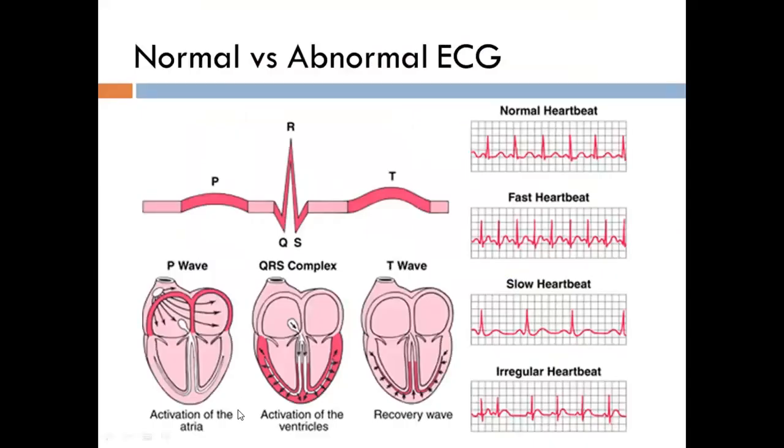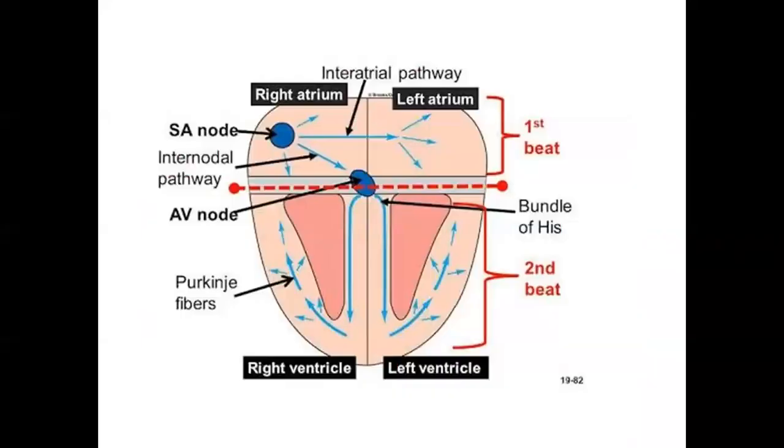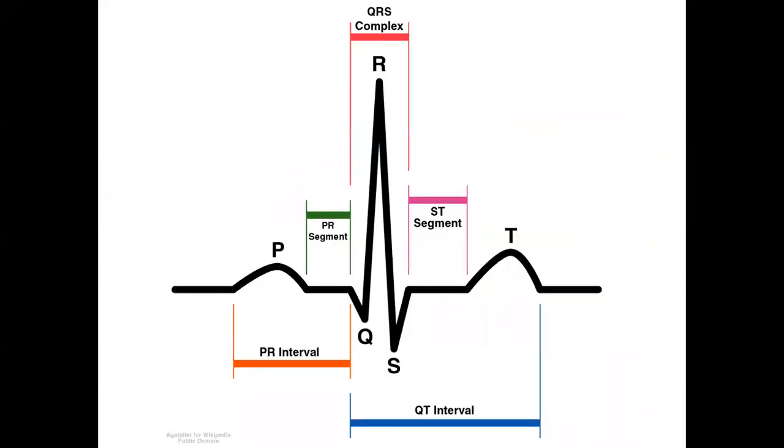Here in this picture, we see this one is called the SA node. It is the AV node. So the SA node can produce impulses because the heart is a specialized tissue or organ. They can produce the impulses. It is electricity. So in this picture, we can see the normal events or waves of the EKG.